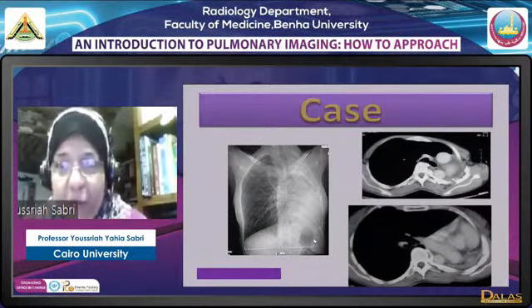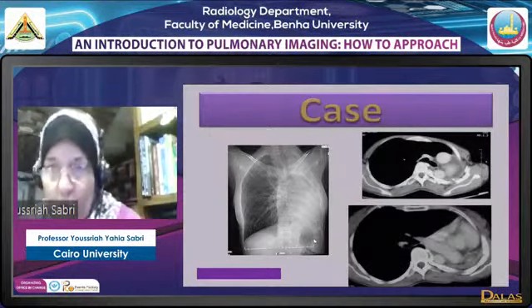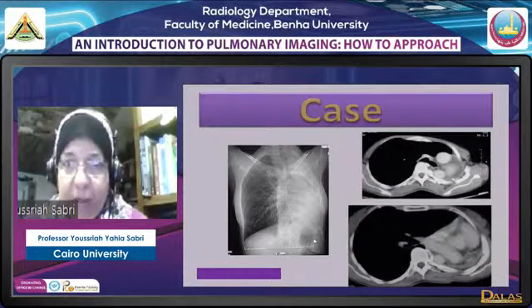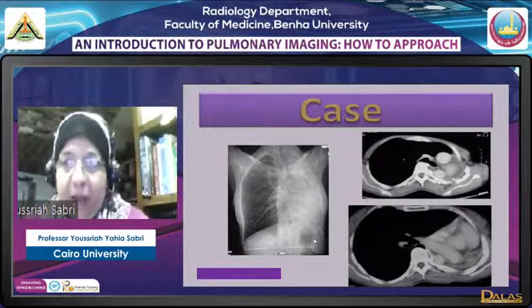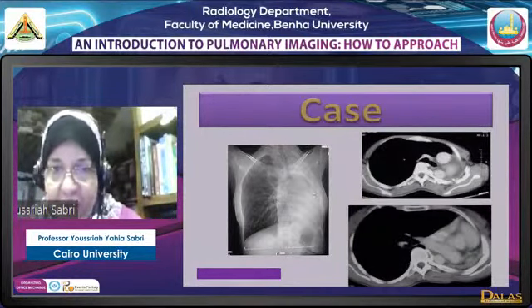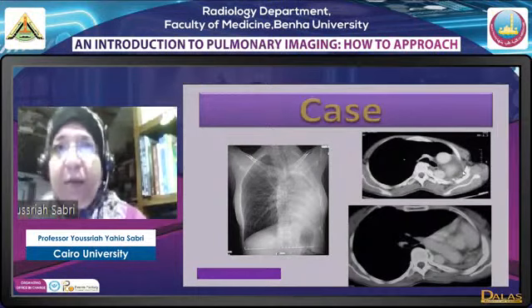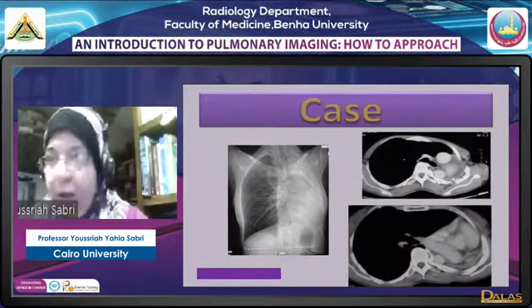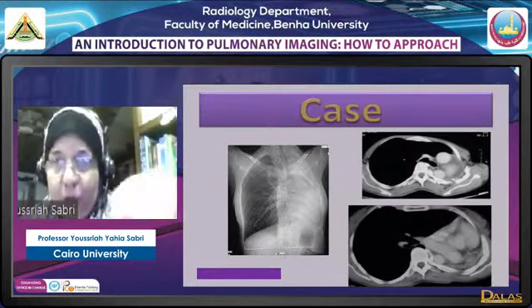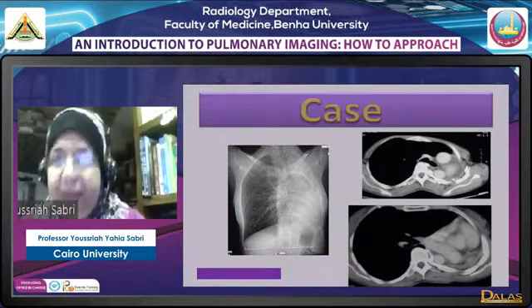What are the causes of volume loss? Either of two things. Either we have a collapsed lung or we have no lung at all. Now let us start. Collapsed lung means we see the lung, but it will be small, or we see in CT no lung. If we look here in this opaque hemithorax with ipsilateral shift, these axial images show the mediastinum filling the hemithorax. There is no lung. What are the possibilities of no lung? Well, either there was a lung and it was removed, or there is a congenitally absent lung. Can we differentiate? Yes, we can.